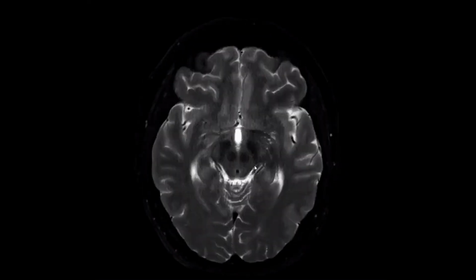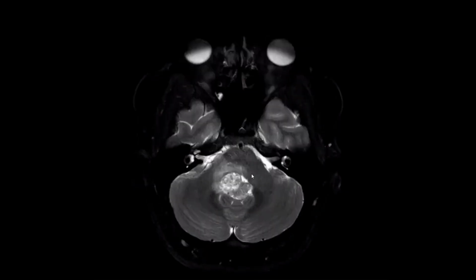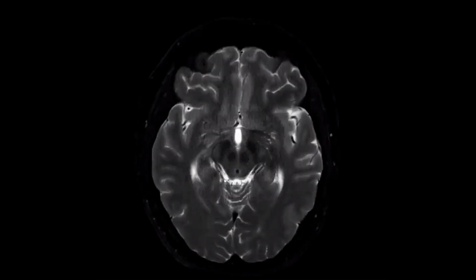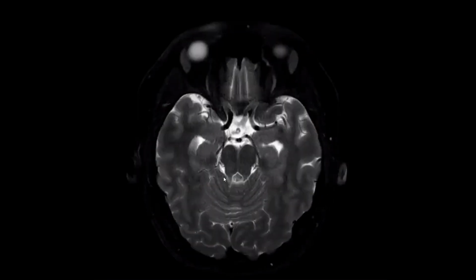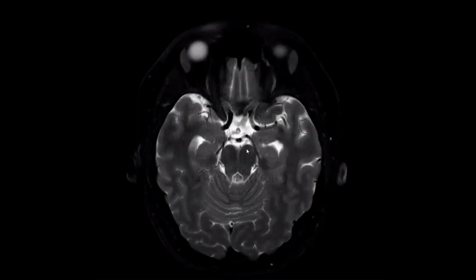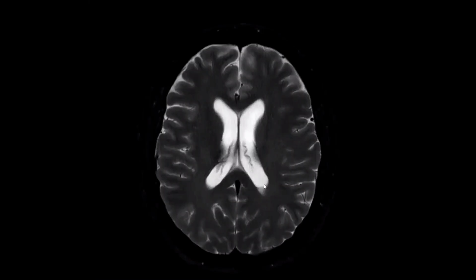I want to look for it in post contrast to see if you have any complications for this space occupying lesion, apart from the compression and edema signal of the surrounding brain tissue. Yes, I can see that there is dilatation of both temporal horns of the lateral ventricle. We have very subtle dilatation of the temporal horns, so this is going to be early hydrocephalus. Very early. Okay, totally agree.